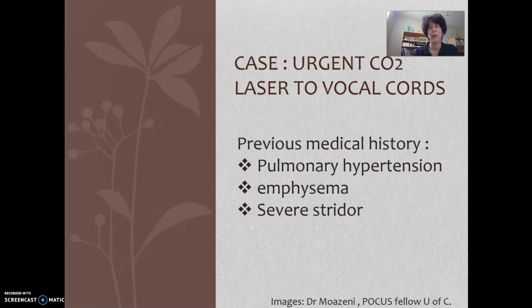Hi everyone, we're going to do some more focus. We're going to start with the actual cases. I would suggest if you haven't reviewed the normal echo and the didactic on the RV function that you go back and look at those before you start doing some of these cases with me.